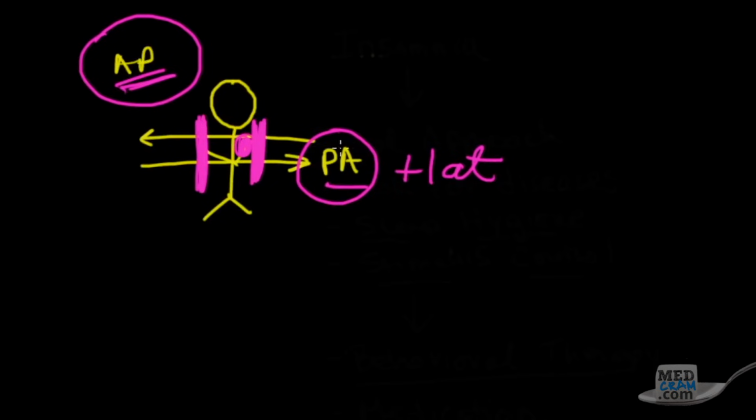In an outpatient setting where the patient's ambulatory, you're going to get a 2 view, PA and lateral, where you're not going to get magnification artificially, and you're going to be able to get a better view. Now, generally speaking, we like to have patients take a deep breath in when they shoot the film. That way we can accentuate and see very well all the different areas of the lungs.